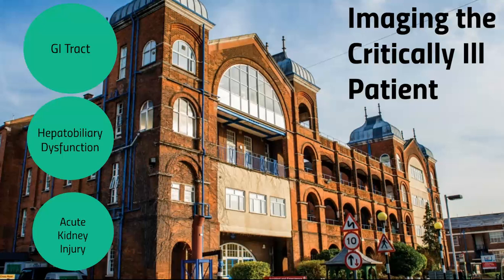My name is Dr. Sandeep Pathak, consultant radiologist here at Whipps Cross Hospital, and in the next few minutes I'm going to show you some pictures of hospitalized patients who are very unwell because they have critical problems with their GI tract or hepatobiliary system or kidneys. I will begin with the GI tract.